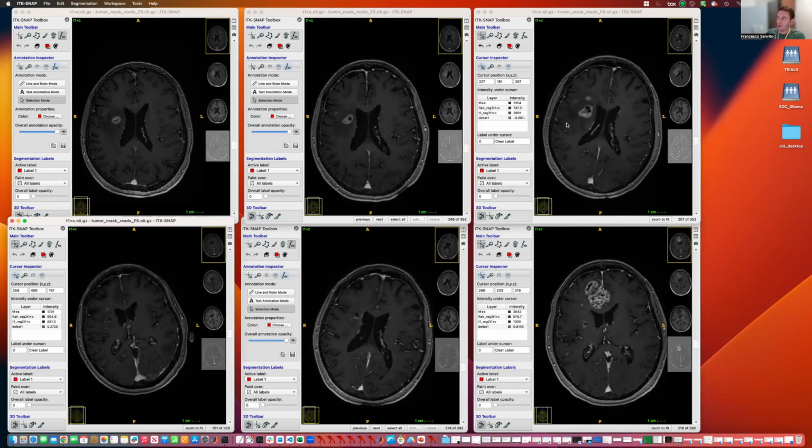If there was no PSP event here, so stable response, and then the lesion grows, we may have to wait for a confirmation of progression if we are still within a timeline that we want to obtain confirmation of progression for. But in this case, after PSP, there is never another instance of preliminary progression that should be confirmed. It's straight away progression after PSP. And this growth is called a growth compared to nadir after PSP, which is the smallest size after PSP.